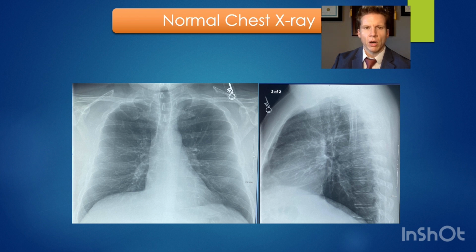So things that are too dark could be a sign of gas where they're not supposed to be. So looking at the mediastinum, is that either pneumopericardium or is there a sign of pneumomediastinum? And I don't see anything that is too black around the heart or tracking up to the base of the neck. Again, we've got this normal amount of adipose tissue here in the supraclavicular regions that should not be confused with pneumomediastinum or subcutaneous gas.